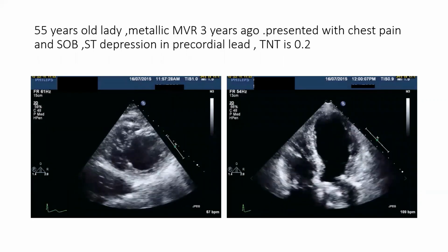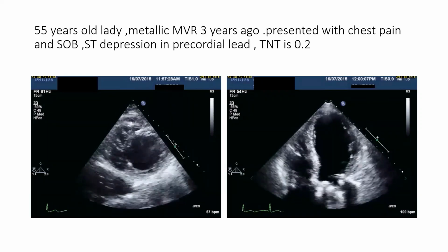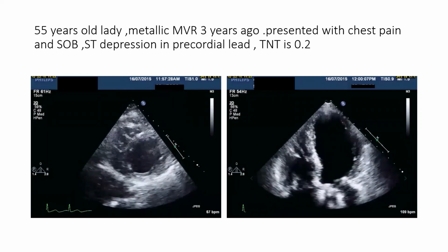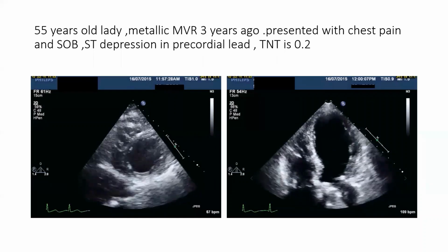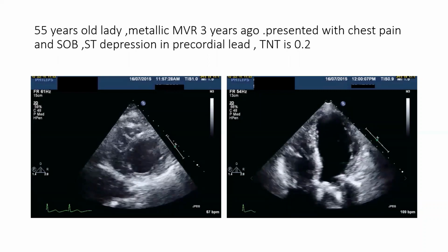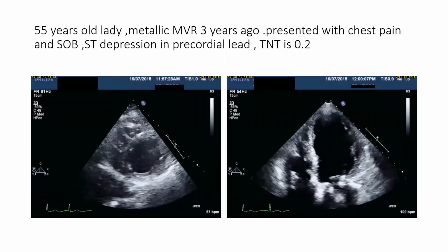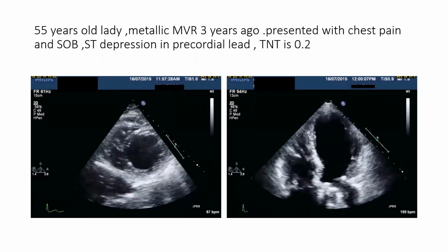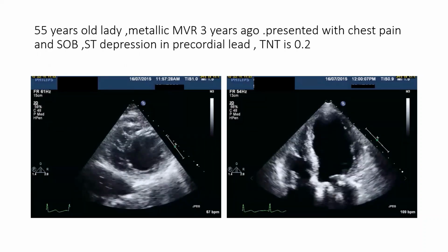If you evaluate this ejection fraction, it's like what, 25, 30? It was 45. It was 25, and now 45, less than 24 hours after her initial presentation. She started to recover. Sometimes the recovery in stress-induced cardiomyopathy is so fast. It might take a few hours.